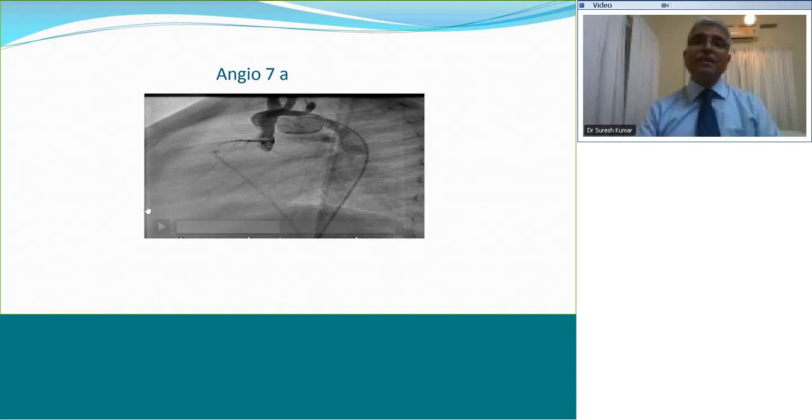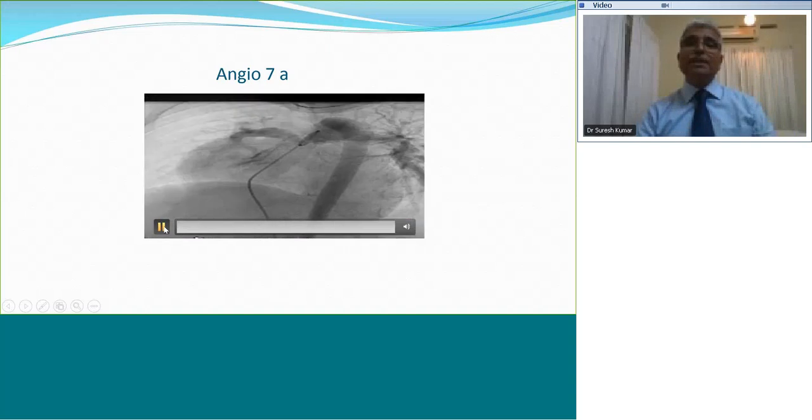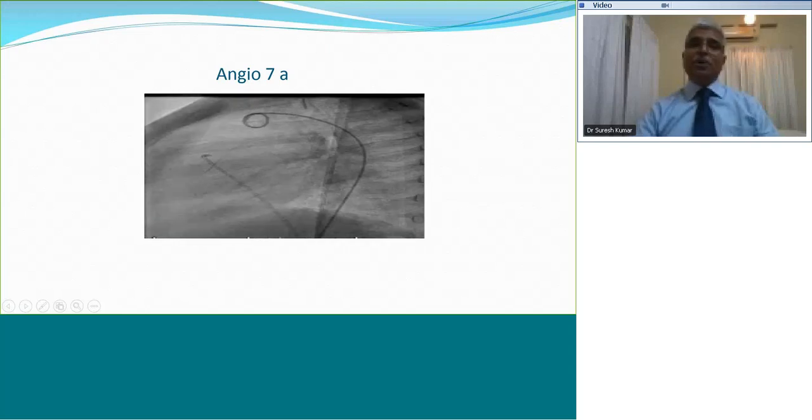Here we go. This aorta, look at this ascending aorta, it's obviously narrowed. No, there's a severe supravalvular stenosis of the ascending aorta, or you can say that the ascending aorta is severely hypoplastic. Then it opens up, and then the arch again becomes narrow and leads to a severe coarctation. Just watch the aortogram. Don't look at the PA angiogram. You find that the proximal aorta is quite hypoplastic. It looks all chewed up, and the proximal aorta is very small, then the arch is hypoplastic, and then there is severe coarctation.